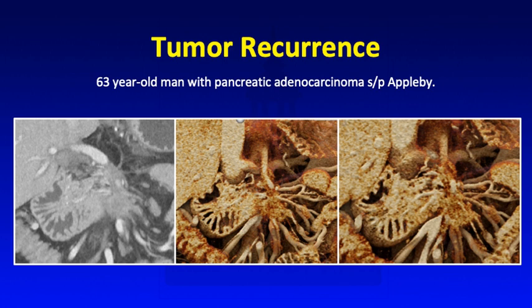And as I mentioned before, a lot of times with post-op pancreatic imaging, you always see a little bit of soft tissue stranding in the resection bed, and it can be rather difficult to determine if that's just normal postoperative changes or if it's representative of local tumor recurrence. With cinematic rendering, because we have improved depth perception, it can make the soft tissue recurrence look a little bit fuller, look a little bit more mass-like, and that can help us make the decision.